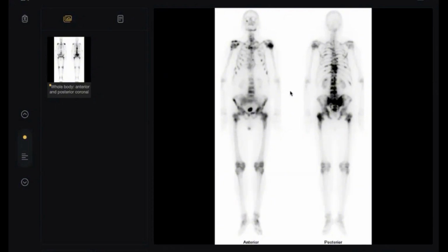Lytic lesions do not take up the tracer. So myeloma is a lytic process; myeloma doesn't cause any uptake. Why? Why does prostatic cancer cause marked uptake? Myeloma is a cancer too. Sir, because the osteoblastic activity will take up more MDP, but the osteolytic or osteoclastic activity will not take up the tracer. I will ask you another example. Most of the metastases cause uptake. Why?